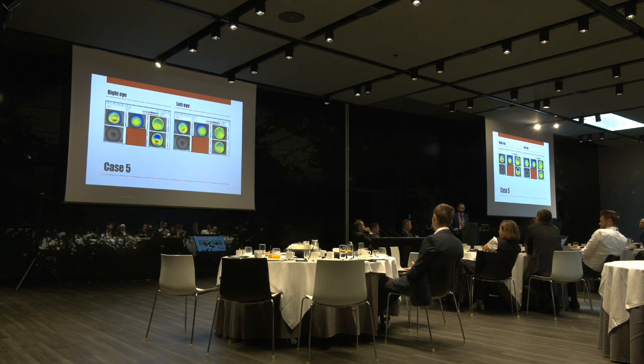Now, there is 40 microns of posterior elevation in the right. Look, the pachymetry is around 450. Posterior Gaussian. Well, I don't have the MS39, so I cannot show you everything, obviously. But do we all agree that this is a keratoconus? With posterior elevation, anterior elevation, decreased thickness, it is a keratoconus. There is no doubt. Yeah, it could be Fuchs. No, then the endothelium is not. Okay, it's a strange case, I'm telling you.